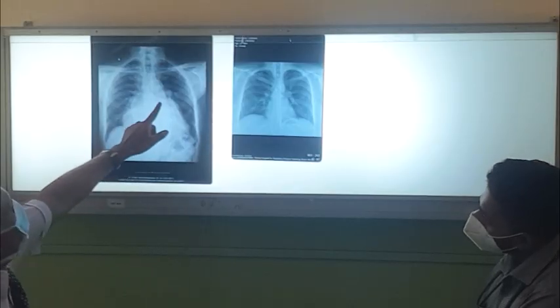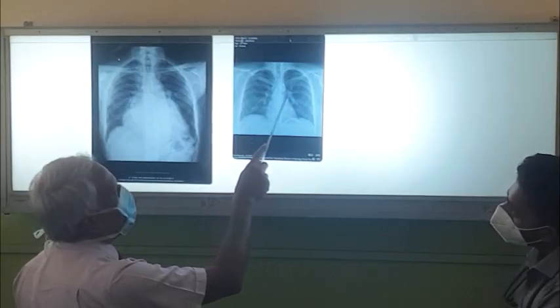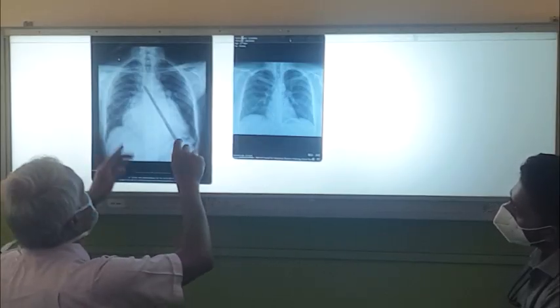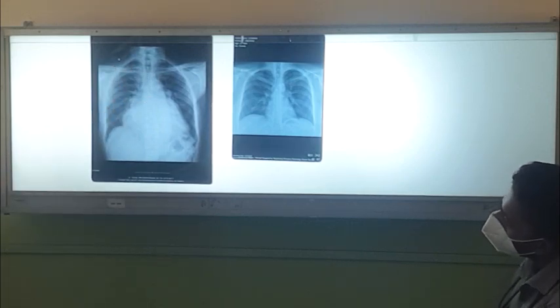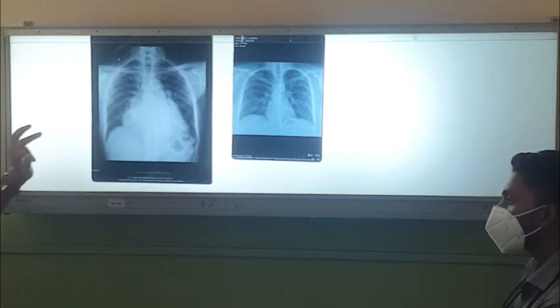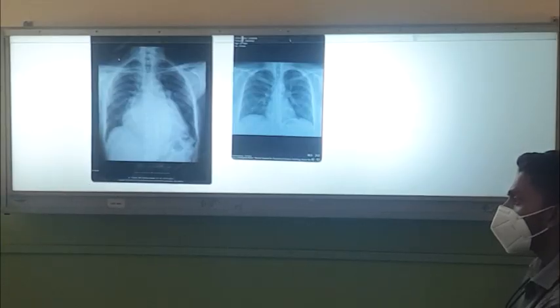Left atrium is dilated. So when it is dilated, now this is the carina, right? The normal appearance. This carina gets widened. So below that, the dilated left atrium is there. So this is what happens when there is severe mitral stenosis, right?